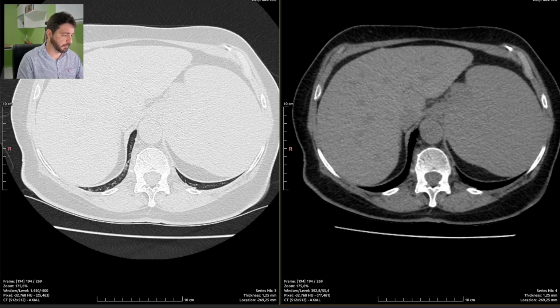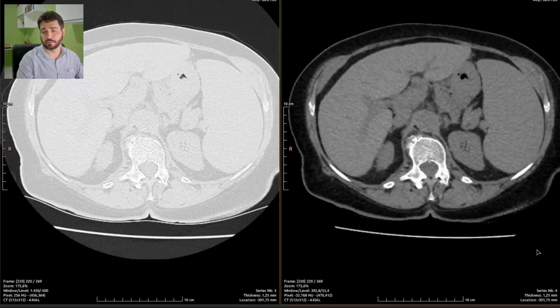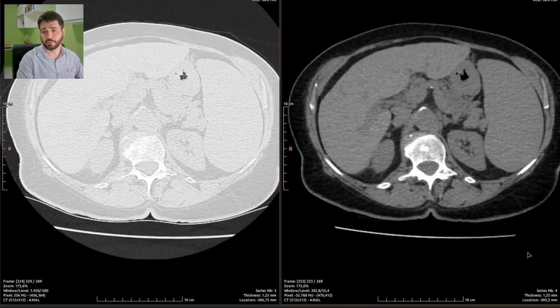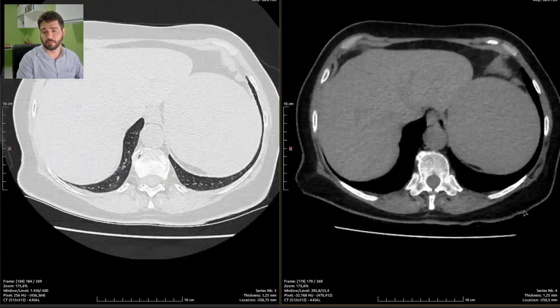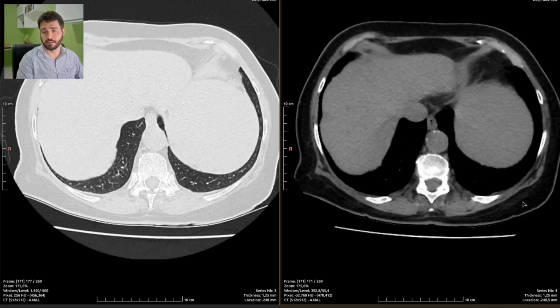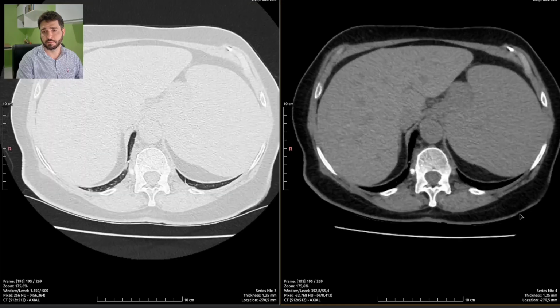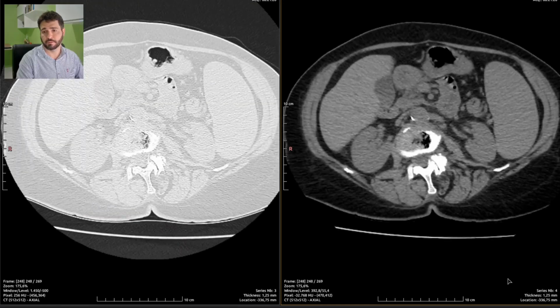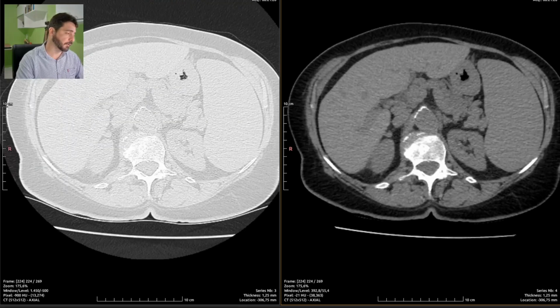Atherosclerosis. Now I'm going to make a footnote to point out to the doctor that there is probably something wrong with the lymphatic system of the patient, some kind of lymphoma or leukemia related disease because of the spleen and lymph node enlargement.